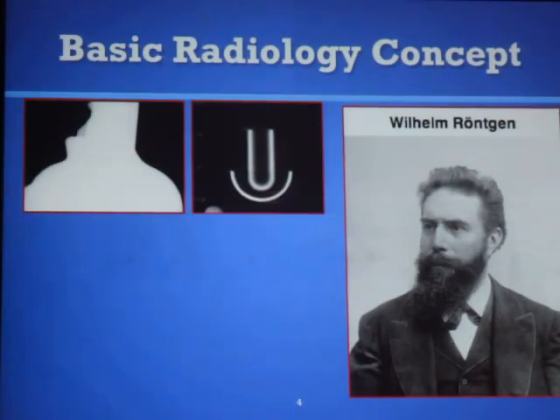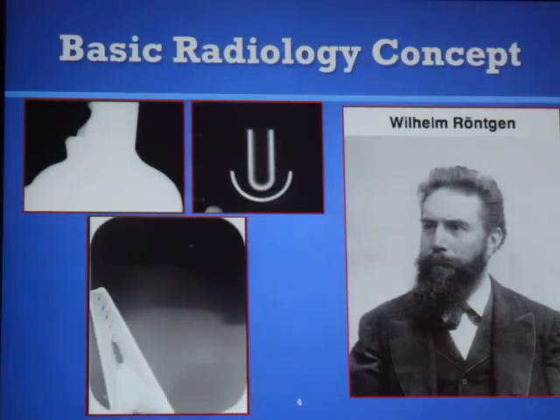Now we see the third object, and that object makes more sense to us. We can see the shape. Actually, we can figure it out in our mind that it is a clip.